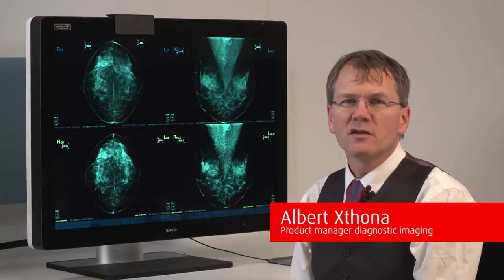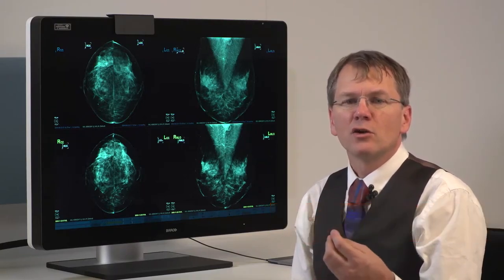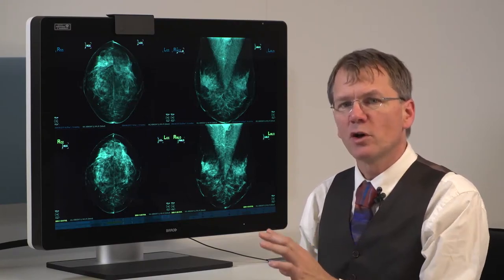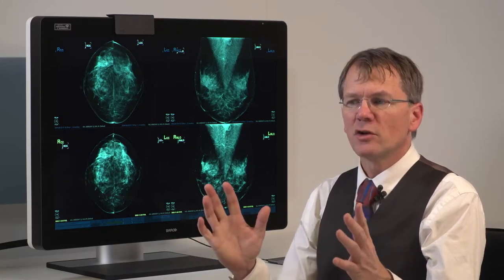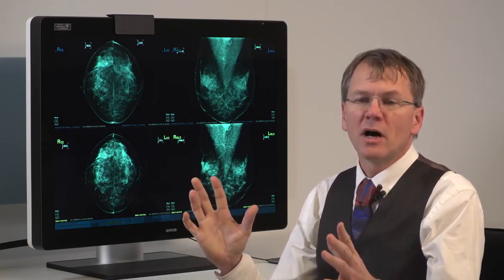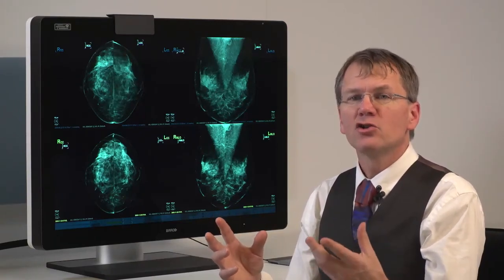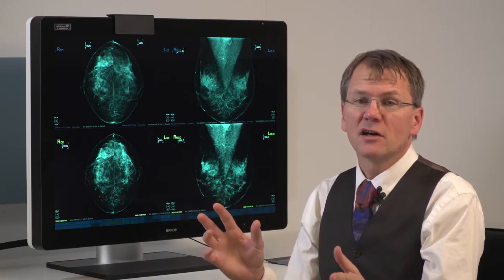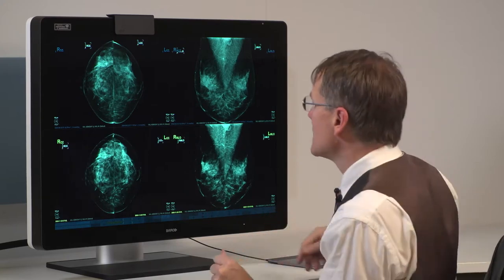The Application Appearance Manager allows you to set the luminance and the colors for each application that's on your workspace. So while your diagnostic application is going to be presented unmodified, it might be that you want to have WordPad or your email shown in a somewhat lower light level because otherwise it would be too bright. So let's look at how that can be set up.